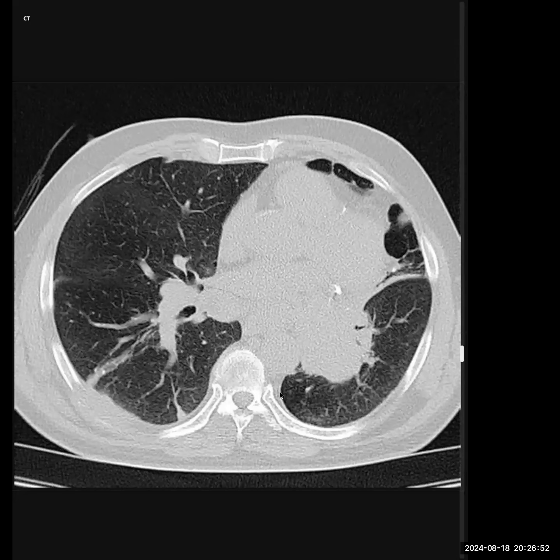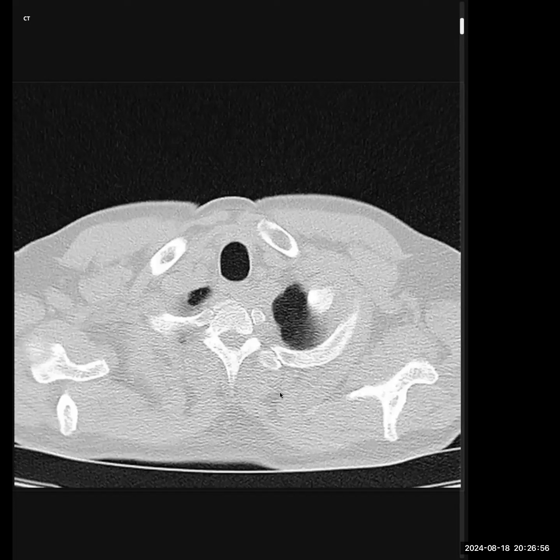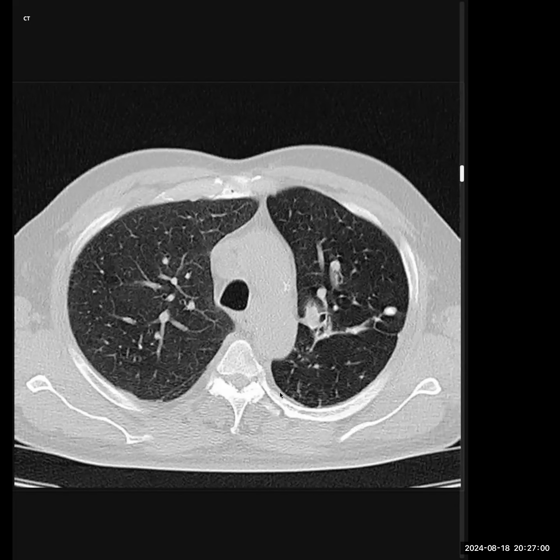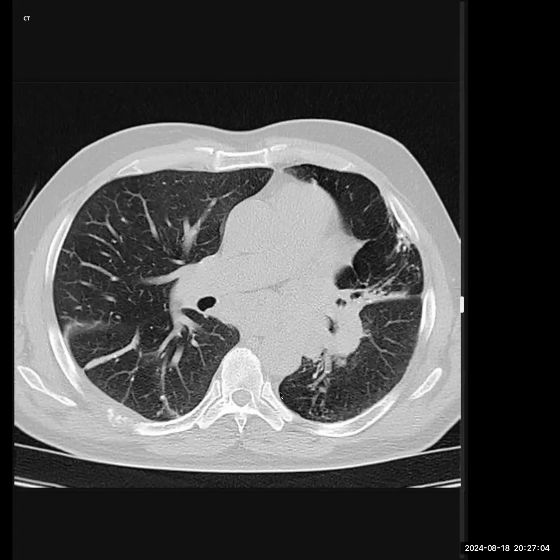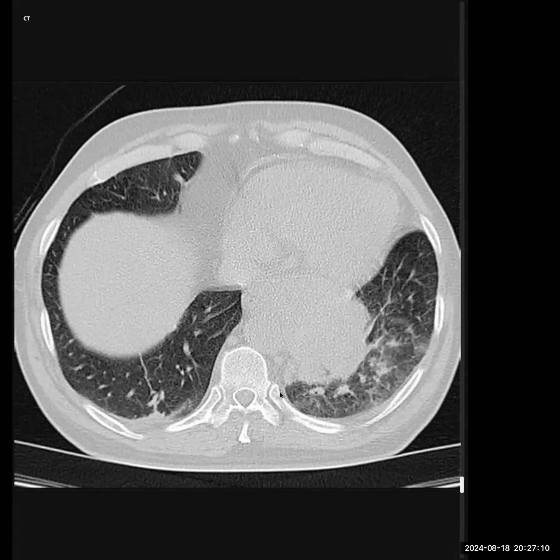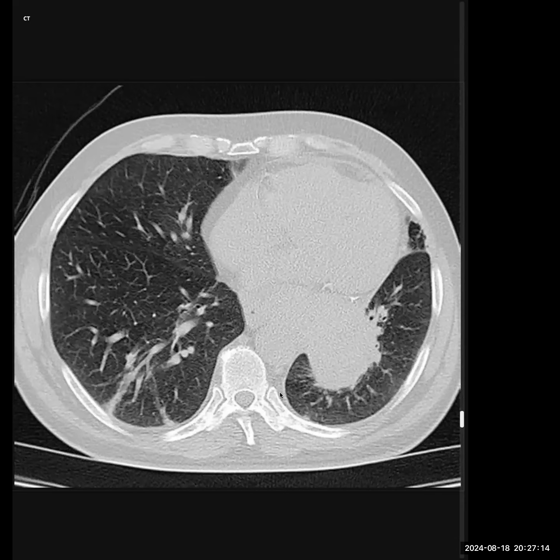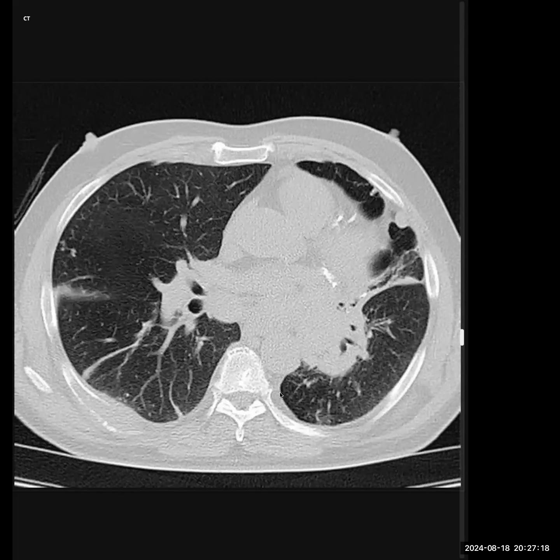Okay. So on the lung window, I can see a few coarse interstitial reticular markings, as well as multiple nodules present in bilateral lung fields. Surrounding this lesion, there are a few ground glass changes along with some fibrotic bands as well.